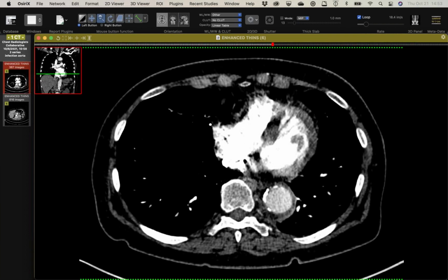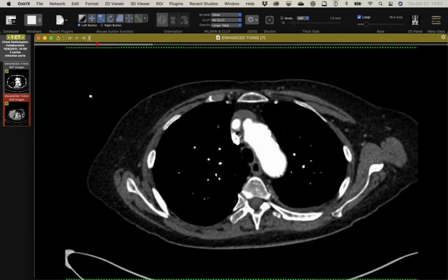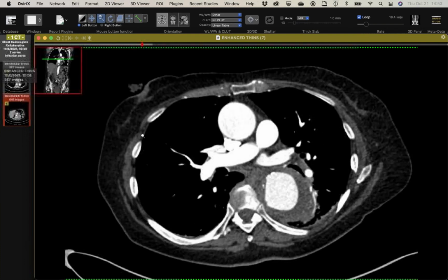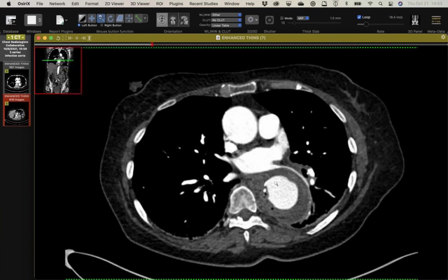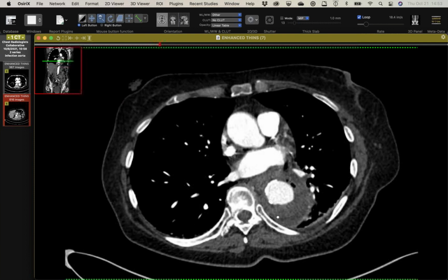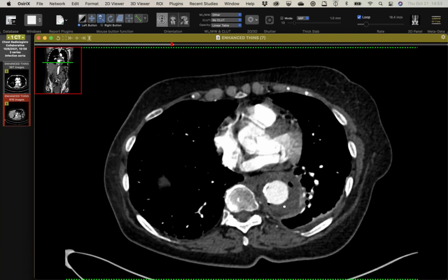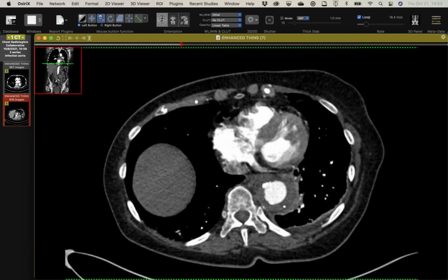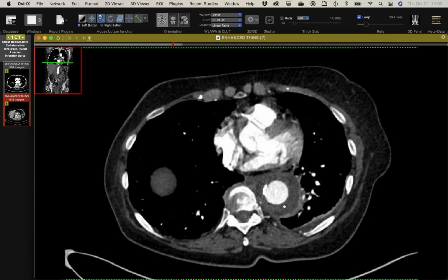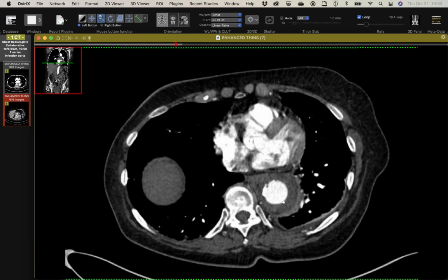So Jeff, had there been surgery on this person? I think I missed some of the history that you gave at the beginning. Yeah, they were again transferred here. So as far as I know, there was surgery after the CT where they did a washout and a primary graft repair, and then they cultured this tissue and it grew out E. coli. Wow. So I presume it's seeded from somewhere, maybe from a UTI or something.